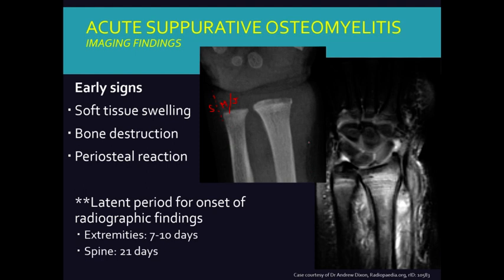When we look at the other side, you can kind of catch some of this wispiness, and it almost looks like it's extending a little bit. So it's kind of getting maybe some feelers, if you want to think of it in that sense. But the fat plane, or the muscle fat plane, is dirty. It has a much more wispy appearance to it. And really, that's the only changes we see on this image. Let me take that back. There's a couple other things, but that's the biggest change we see on this image. So this area right in here, we're losing that nice fascial plane. There is a little bit of change in the metaphysis here.